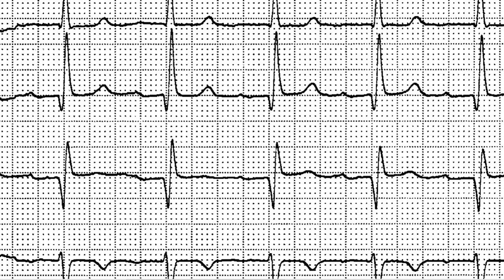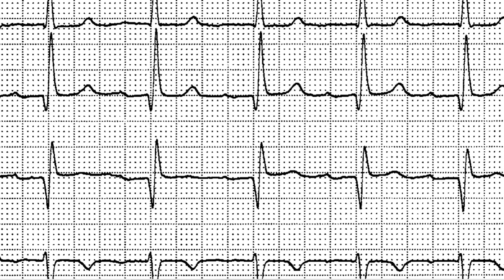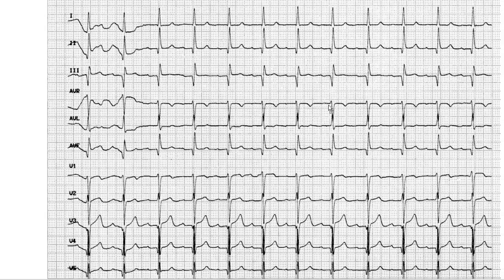Oh wait, you start from the beginning of the P wave, and you take a lead in which the P wave is as big as it is. So let's go here. Start here. 1, 2, 3, 4. 1, 2, 3, 4, 5, 6. It is definitely 6. Okay, fair enough. So 6 times 0.04 is 0.24, and that's beyond the limit. And so you mark that as a pathology. It's a prolonged PQ interval. You gotta mark that as a pathology. So that's that part.